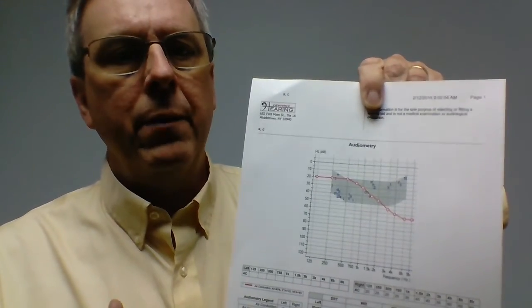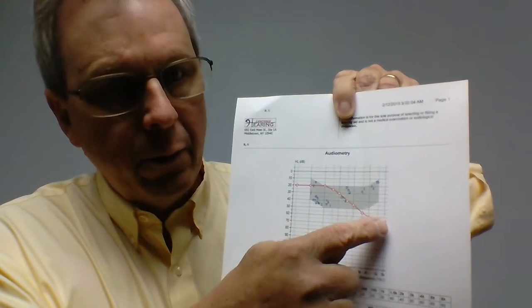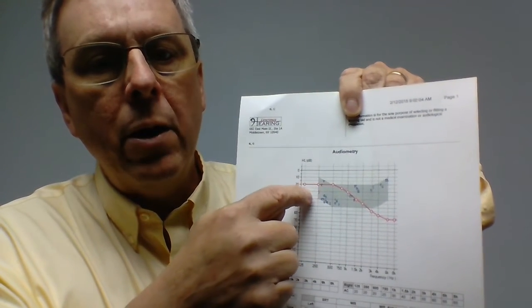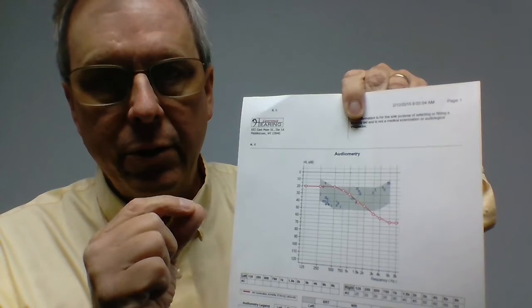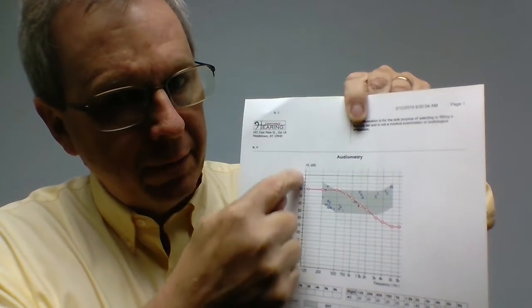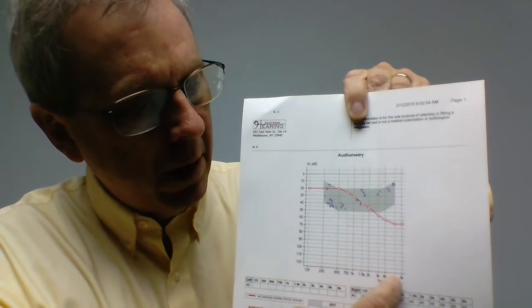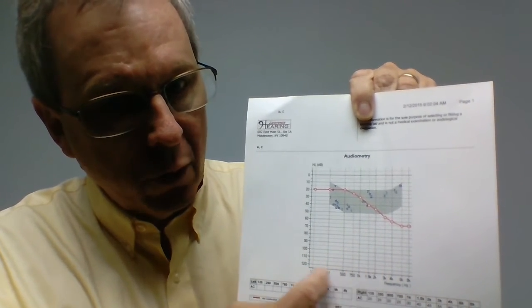So, what I have here is an audiogram for a person. You'll see there's a red line. And the red line is where their right ear hears the tones. What happens as we go down the graph this way, I make the beeps get louder. As you go across the bottom, the pitch of the tone changes.